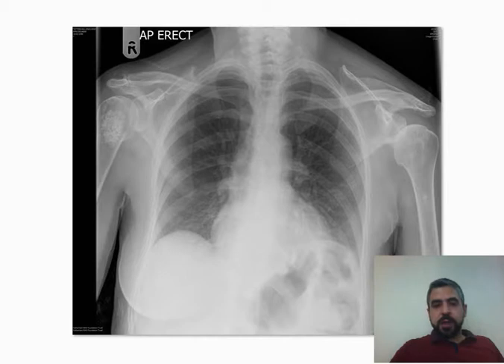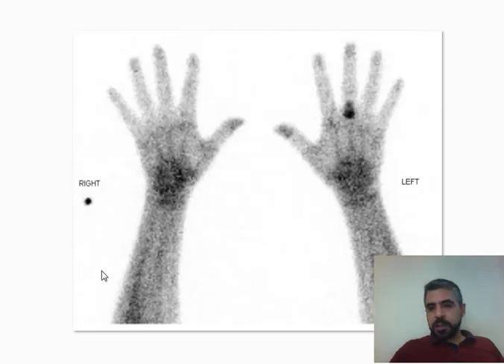On the bone scan images, enchondroma usually retains radioactive isotope, as in this case you can see on the left side there is a lesion that is retaining radioactive isotope, consistent with an enchondroma.